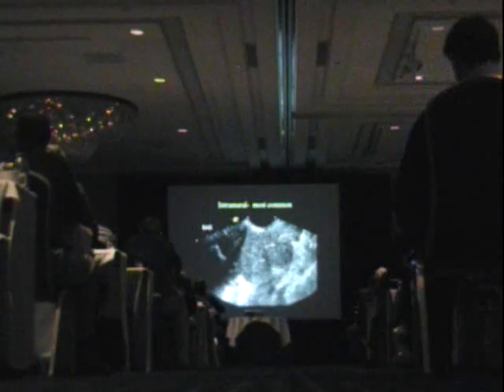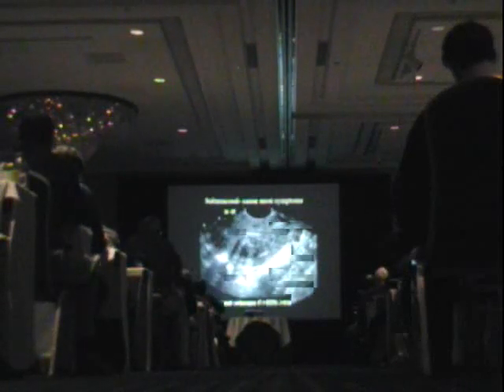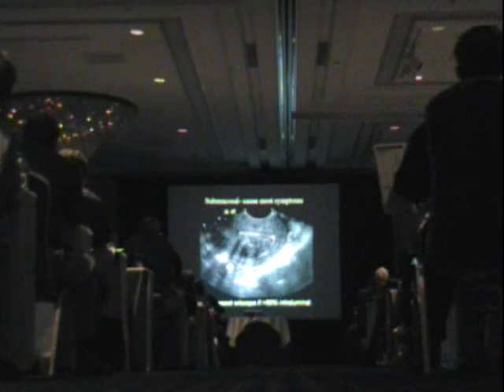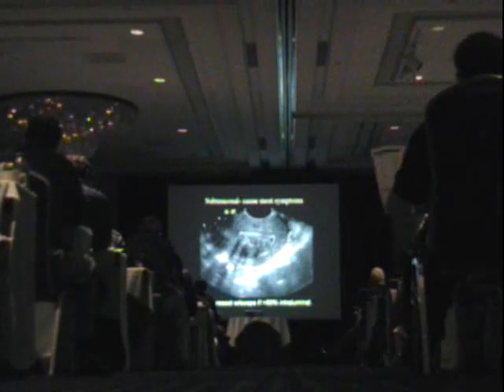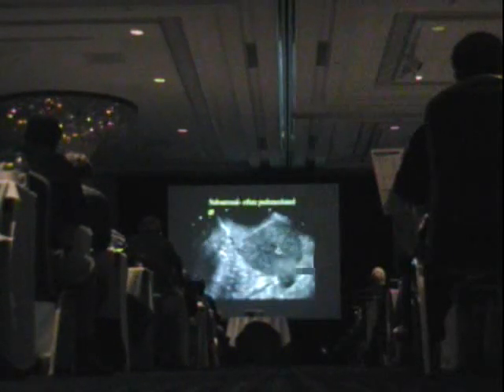Here's that case that I showed you before, the lady who has an intramural fibroid, very hard to see the edges of. As opposed to this, when the fibroid is submucosal in location, you can see that the endometrial stripe is split here and here with a little trickle of fluid outlining the endometrial cavity for us. Now, these are the ones that cause the most symptoms. These are the ones that patients present with very heavy bleeding. And the good news is that if at least 50% is within the lumen, these can be taken out with a hysteroscope. Apparently they can just dig out the fibroid and then the endometrium will regrow right over the top of where the hole is, and very quickly.